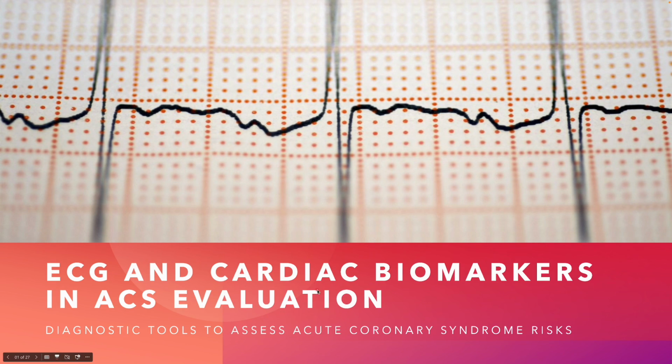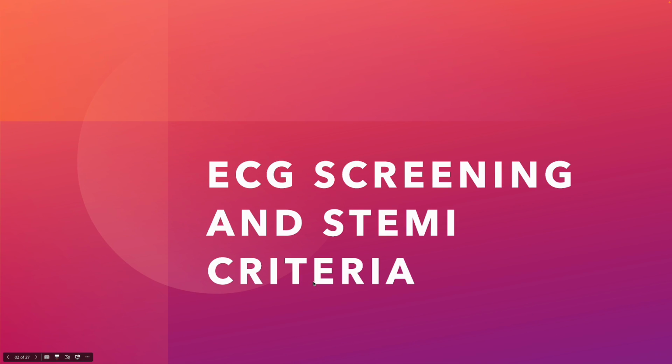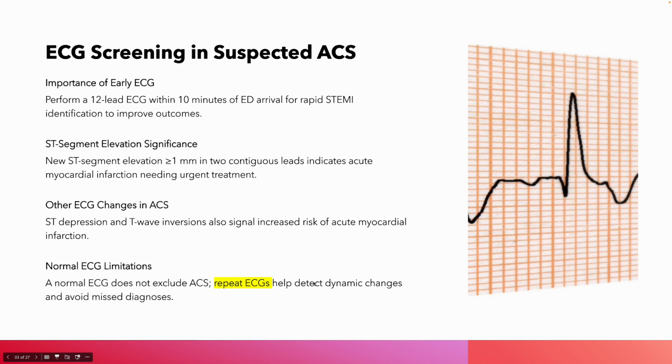Series. Now we're going to continue talking about ECGs, how you could diagnose myocardial infarction on an ECG, and which site is being involved, and also the culprit artery involved. Now for the criteria of ischemia and acute coronary syndrome, you would need an ST segment elevation in at least 2 contiguous leads, and the elevation has to be more than 1 millimeter, so 1 little square.